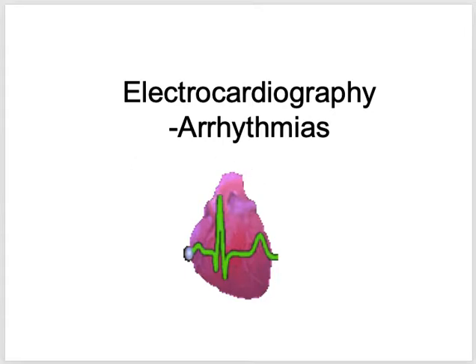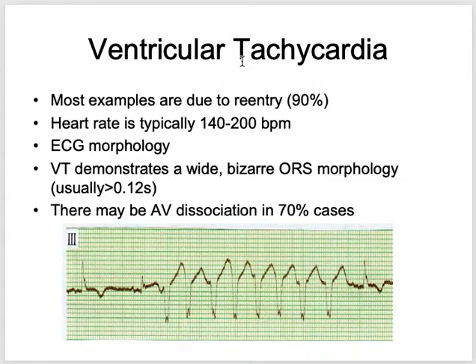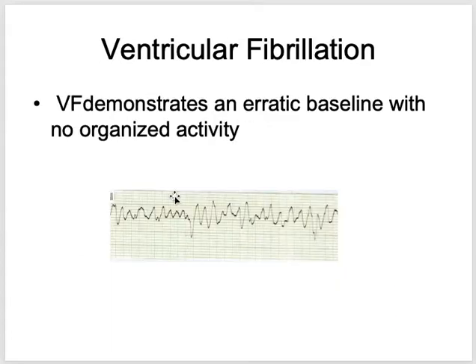For example, I will give you one example in this regard. There is something called ventricular tachycardia, simply when the heart rate is too high. For example, this one. See, the heart rate is too high, by the way less than 300 for sure. Again, that box rule you can apply here to calculate the heart rate. But for example, there is something called ventricular fibrillation.